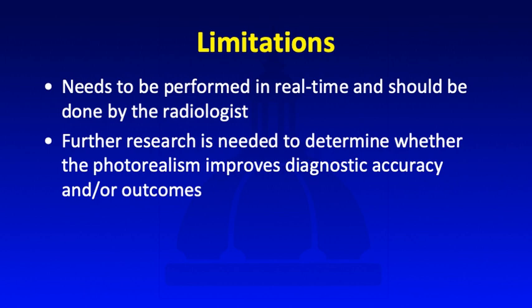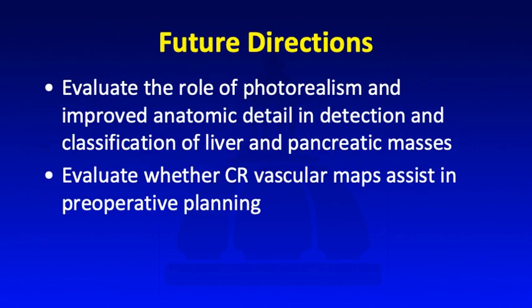Further research is needed to determine whether the photorealism improves diagnostic accuracy and/or outcomes. In the future, we hope to evaluate the role of photorealism and improved anatomic detail in the detection and classification of liver and pancreatic masses, and to evaluate whether the CR vascular maps assist in preoperative planning.